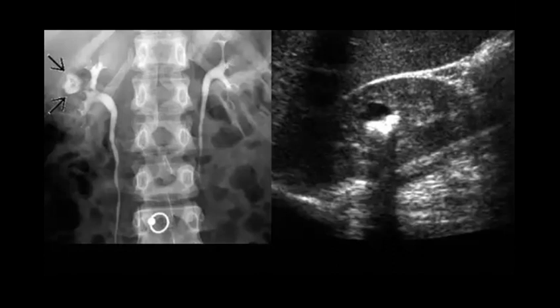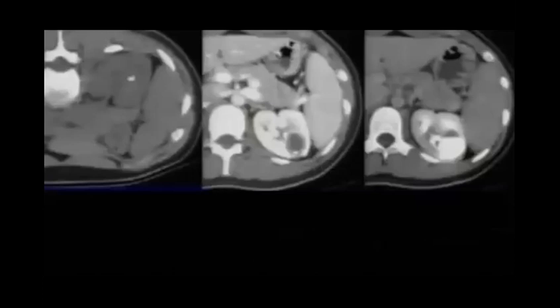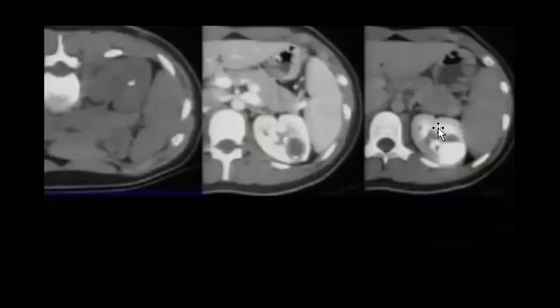Then you can expect in the CT, when you find any pouch that is filled with contrast excretion like this, and you have the previous non-contrast, you can think that it is a diverticulum or what is called hydrocalicosis.